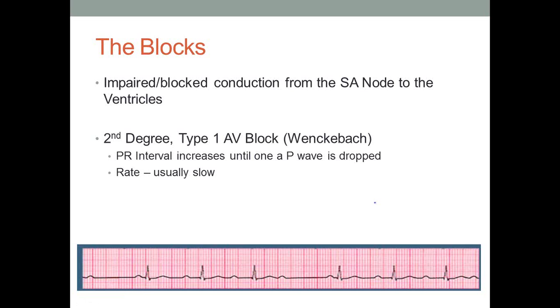So again, go through each step. I can't emphasize this enough. Go through all of your steps. Here I'm just going to identify what the differences are, but make sure when you're practicing this you go through every single one of your steps. So have a look at the P waves here. If we look at the P wave on this very first complex and look at the PR interval, it's normal. It is less than 0.2 seconds. It's less than one big box.